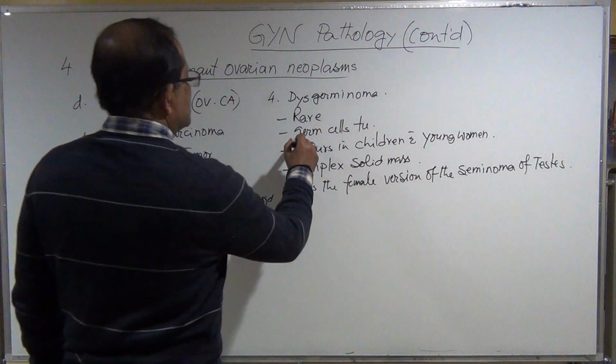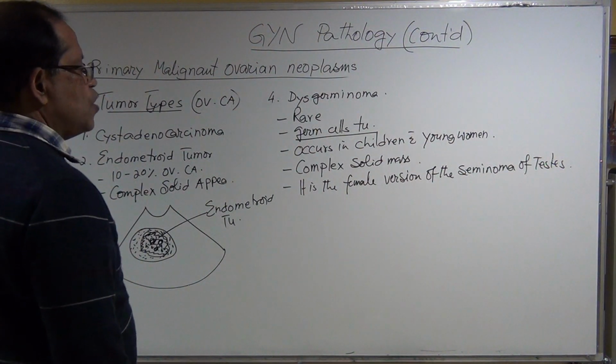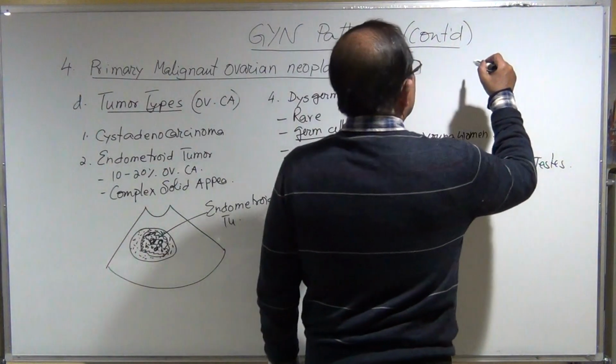So it is also a germ cell tumor and a complex solid mass. How does it look like?